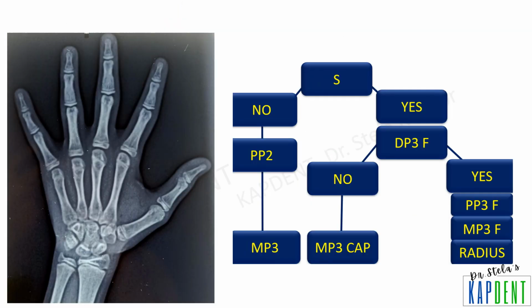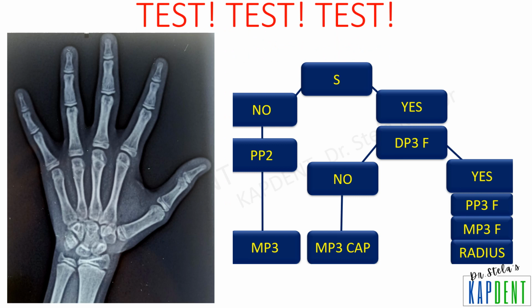Okay, so it's now time to put this newly acquired knowledge to the test. First of all, you may pause the video and see if you can make out the stage.